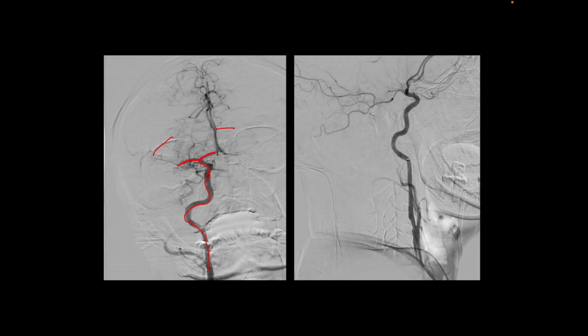So here you can see one. This is the opposite ACA, and this is the ipsilateral ACA, and there is an anterior communicating artery somewhere here. So this carotid artery is supplying both the anterior cerebral arteries. Understood? So what we can make out from this is that the anterior communicating artery is patent, and you can see the opposite A1 also filling. And what you see here is a cut off M1. Okay. And the lateral view, what do you see?